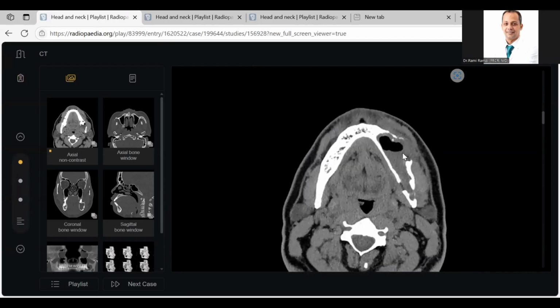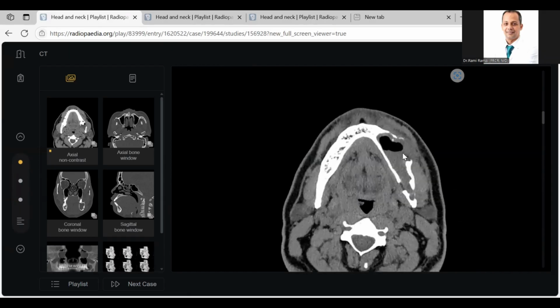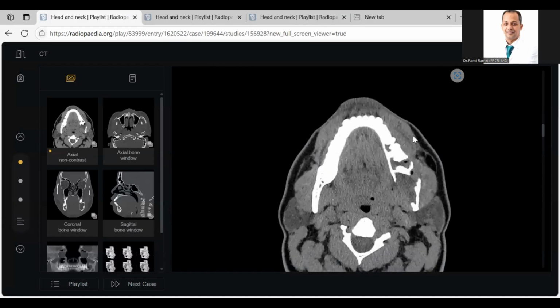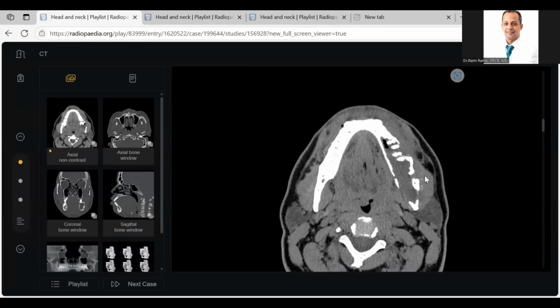Second point, tell yourself before giving a wrong diagnosis or a misleading pathway to yourself: is this the image of abscess or inflammation? The fat planes are almost clear. In inflammation, the opposite, there is extensive edema and extensive loss of fat planes. See here, this is the masseter, very clear.